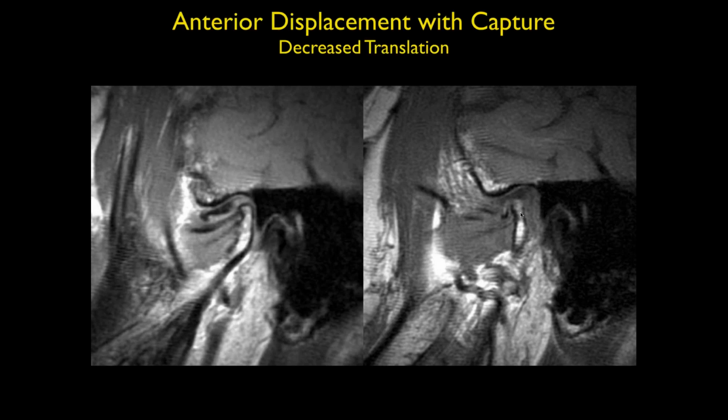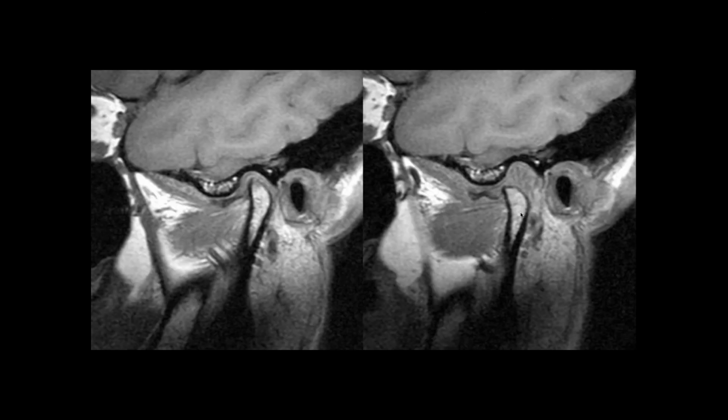So this is anterior displacement with capture, but you have decreased translation. Okay. And the translation is not normal either. It's kind of like it goes from posterior to anterior and back.